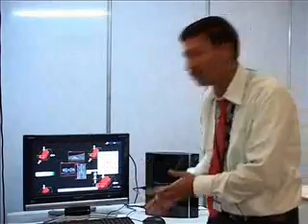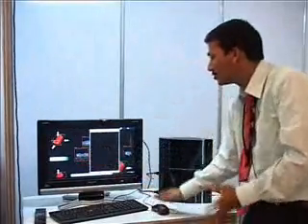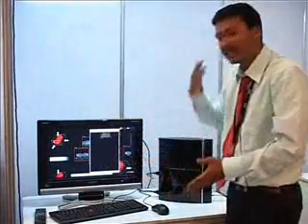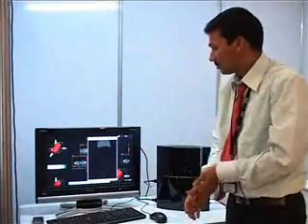Now we'll see our coronal view. Initially it is black, because here all the things are black. Now it's going interior to the volume. You can see this is the front view. We can see the entire body in the slice. Now it keeps on going inside the volume.